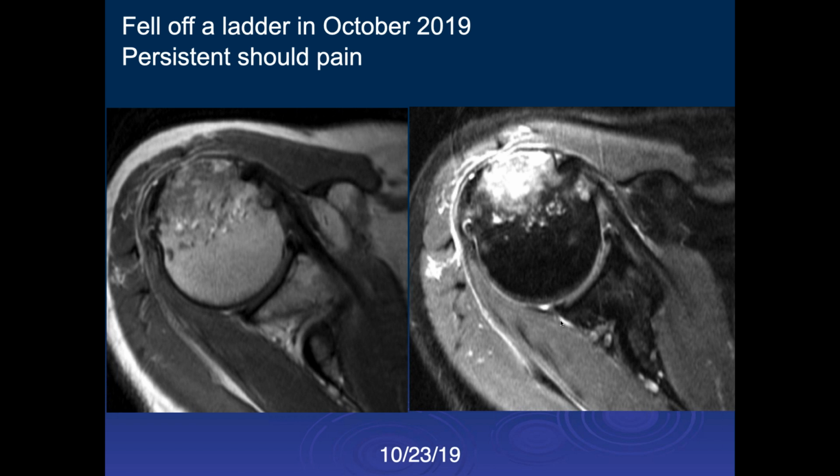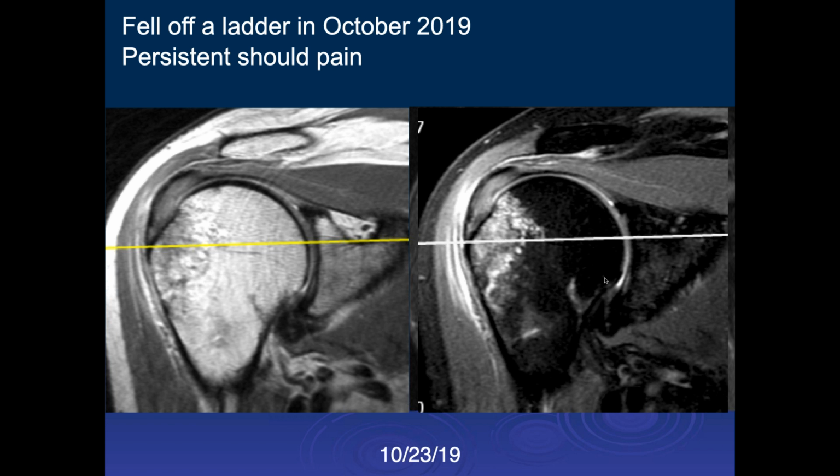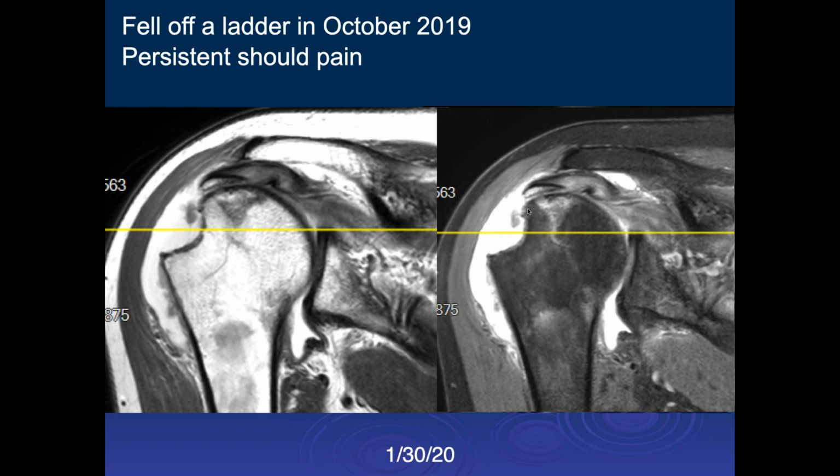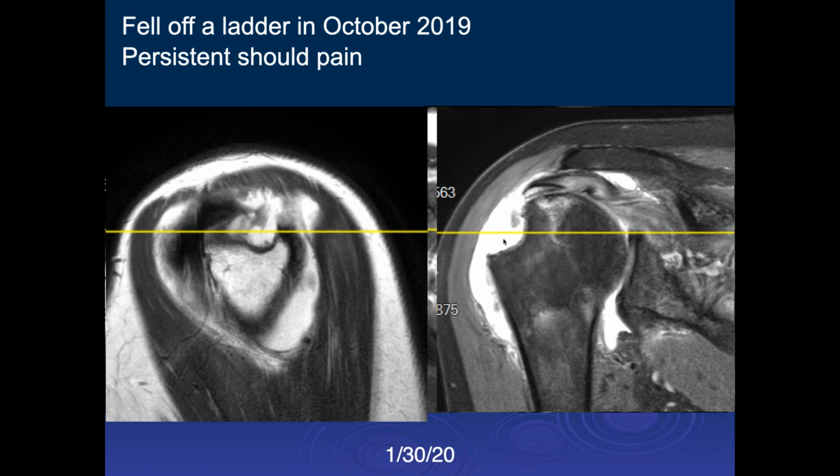So this started out as an extensive trabecular bone injury, but anatomically it was intact. But as you said, there's a lot of trabecular injury here, and you'd worry about the stability of this. And then following up 3 months later, we can see that the traction from the rotator cuff pulled off the bone, displaced it immediately, and now you have a big osseous defect there. This was a surgical case from the get-go.